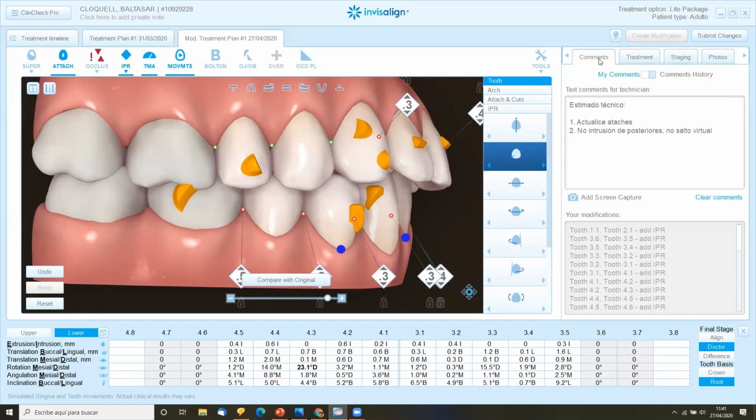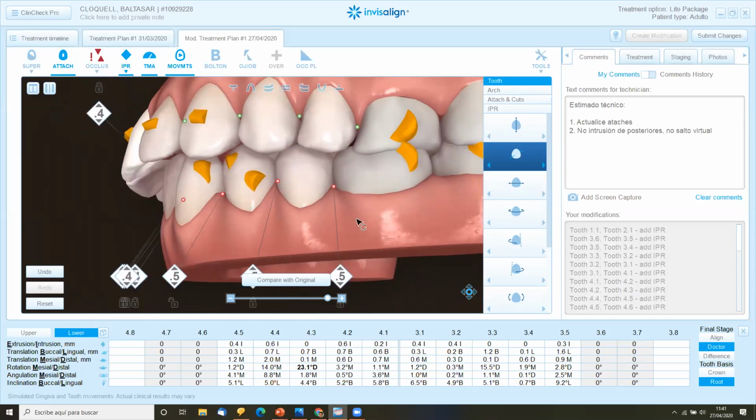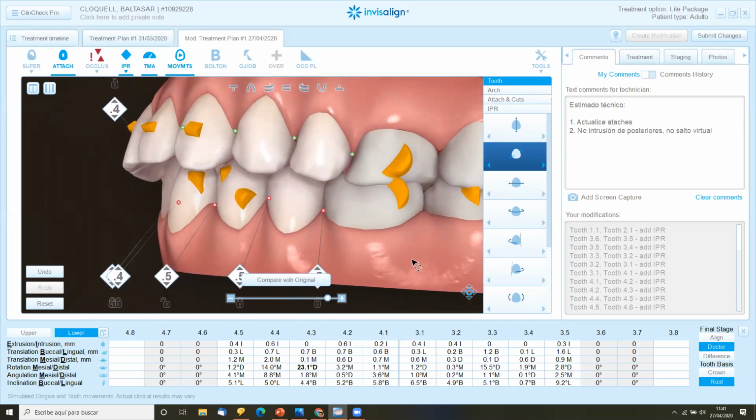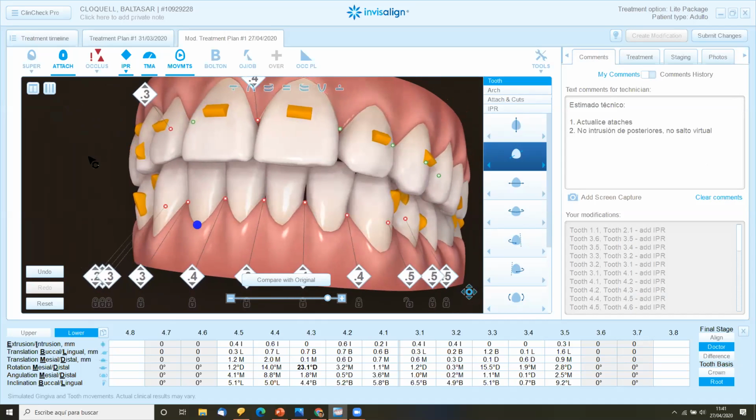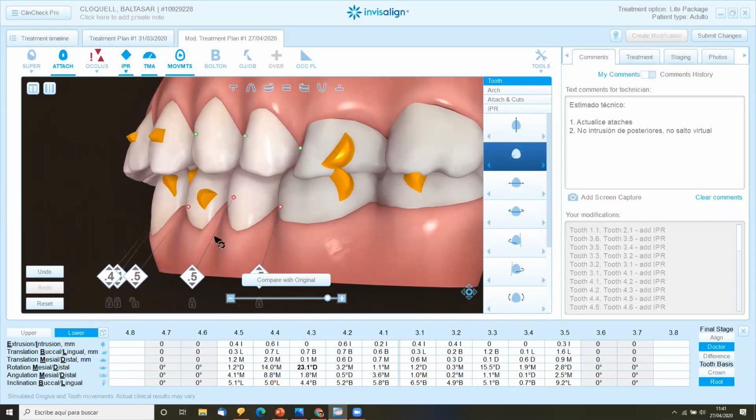And timing, do we have to say something special about the timing? Not in this case, okay? When we receive the next one, we are going to check every single thing with my protocol or with your own protocol, and then we will start changing it, okay? That's it. I'm not changing more positions due to time only, but I hope that you have learned a lot. And we have 5 minutes for questions.